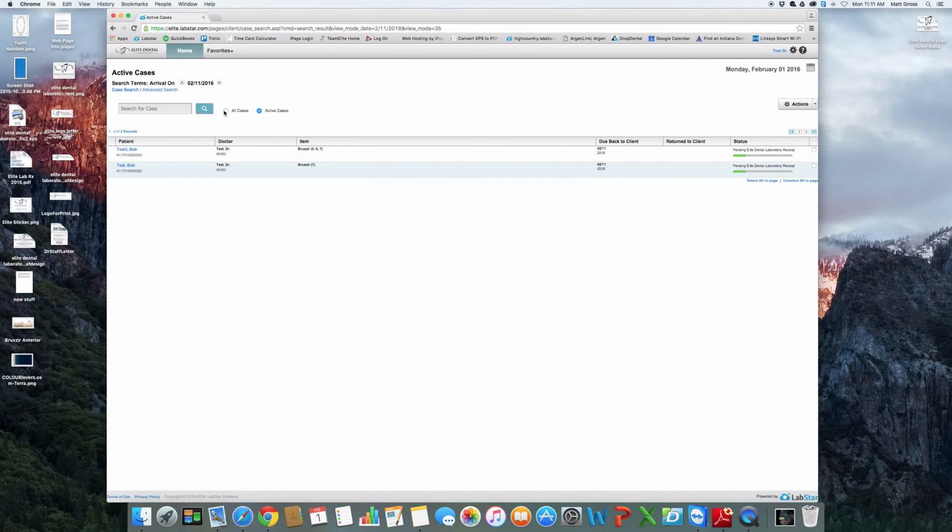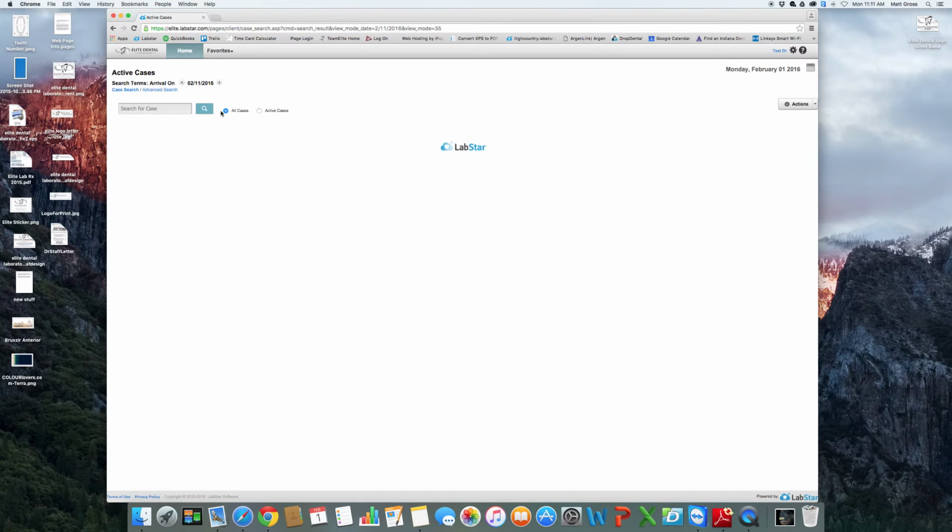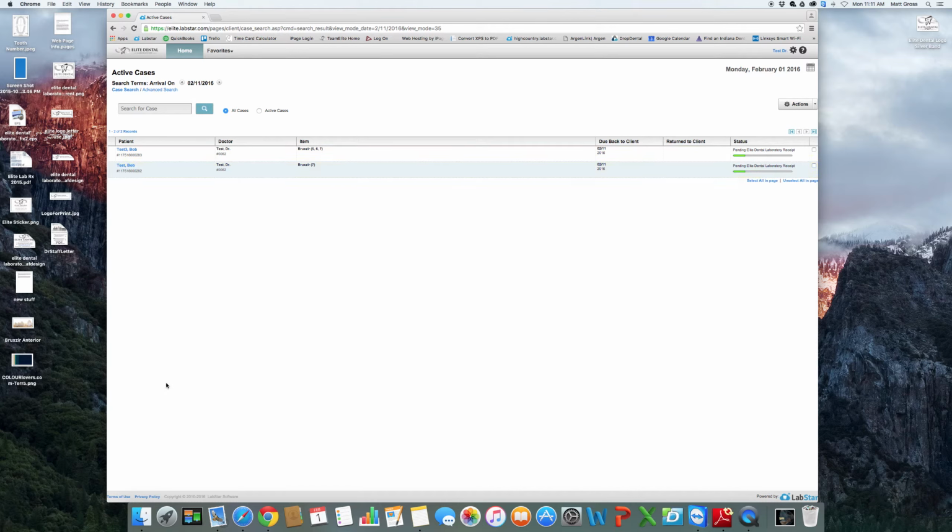You can also click on all cases and see all the cases that are either at the lab or shipping back to you as the doctor. We'll go back to our home page.